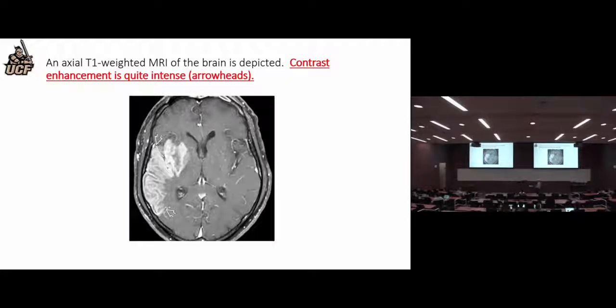Here is something you can detect on a T1 if you give gadolinium. This is probably a somewhat later stage where you start having some leakiness of your blood vessels, and the dye is extravasating. In fact, this is probably quite a bit later, because initially you just have more of a cytotoxic stage and you don't have that much leakiness of your blood vessels. So this is enhancement of a stroke, and I don't exactly know the age it's supposed to be. But you can tell that it was given contrast enhancement because you can see blood vessels all over the place.